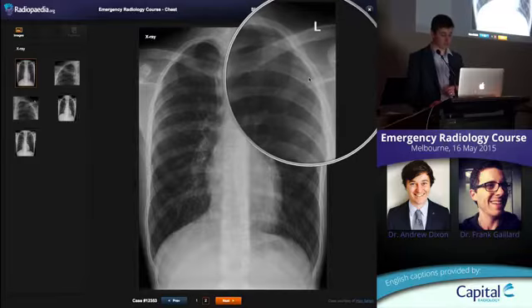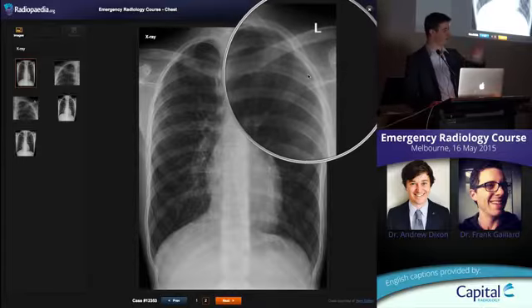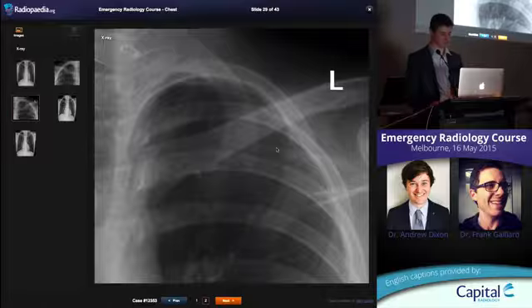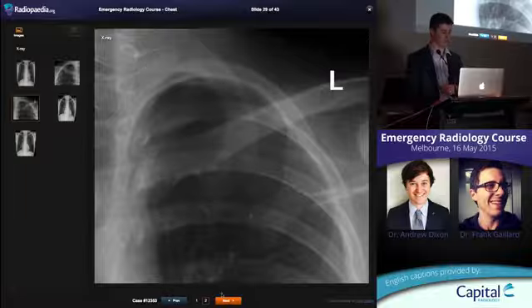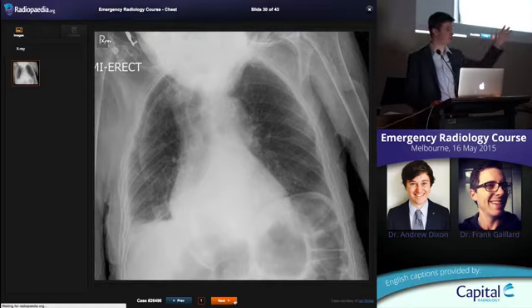On the other side, they've actually got one as well. Very thin line. With the way the ribs go, you can often get that pleural edge following very closely to a rib and make it hard to identify. You need to zoom in and really have a good look and you'll see that little edge there. Okay, so small bilateral apical pneumothoraces. The key is that no vessels go beyond it, and try and find the little pleural edge.